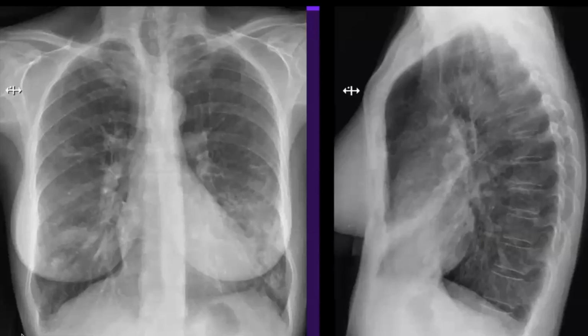Here's an example of lung hyperinflation, and we can see multiple nodular opacities with confluence, particularly anteriorly in the middle lobe and lingular regions. There's nodular areas in addition more superiorly. And notice the pectus excavatum, which is what we have been seeing with patients with nontuberculous mycobacteria.